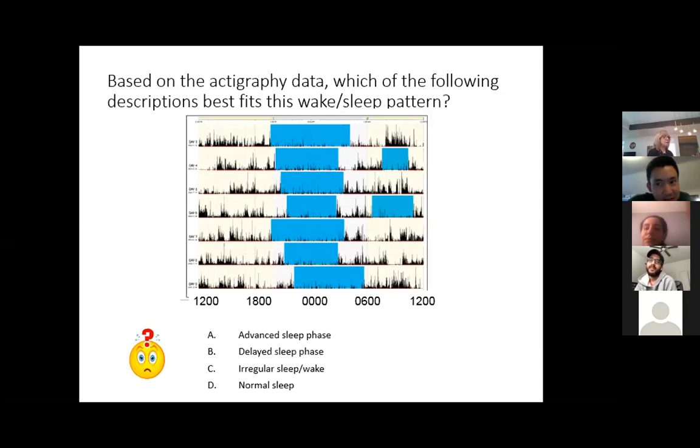Be careful, Nishan. Because in regular, you have to have 3 sleep periods, and then the total amount should still be in a 24 hour period. What's the definition of advanced sleep phase? What time do these elderly people start to get into bed? And what do you see on this tracing? So then I got the times there for you. 2 hours prior to normal, like culturally accepted bedtime. Socially. What do we got going on here?